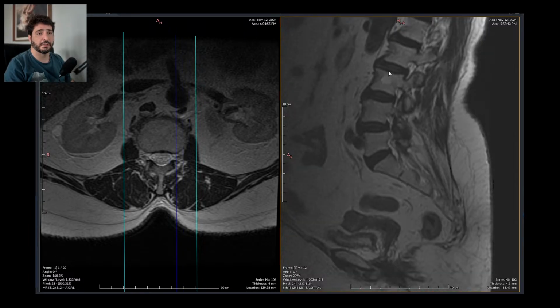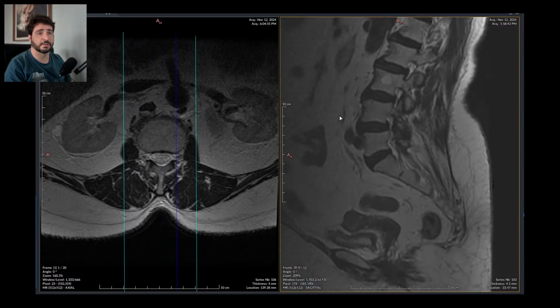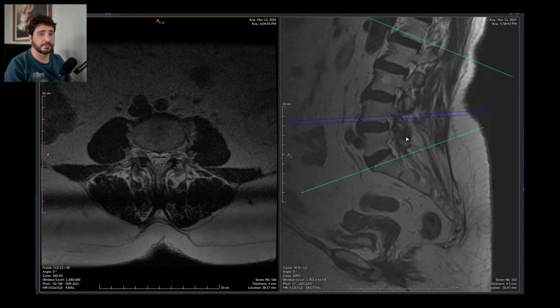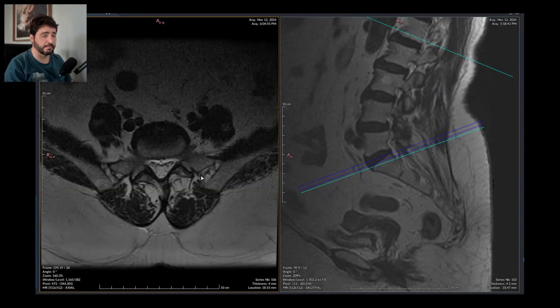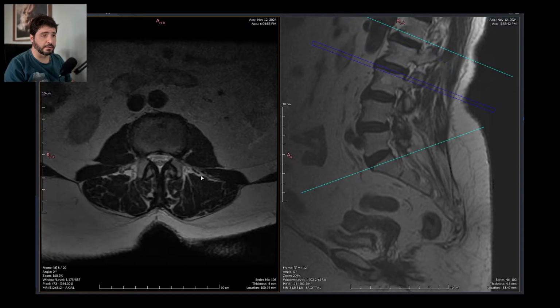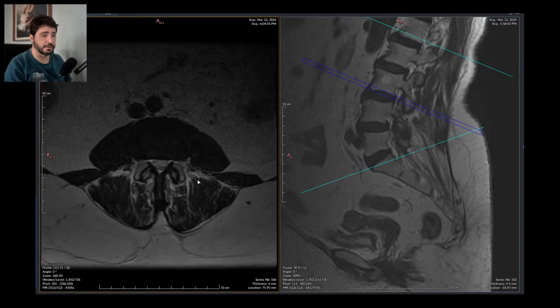This is a hemangioma. I'm not going to report that because reasons. It doesn't show on the T2 on the axial because the technician thought it wasn't of importance, so I'm not going to report it either.